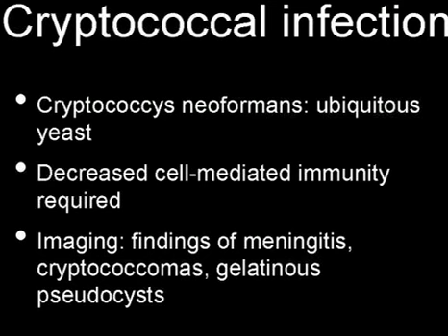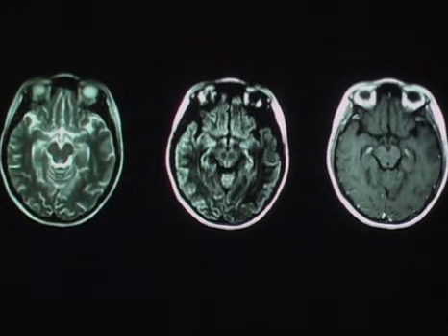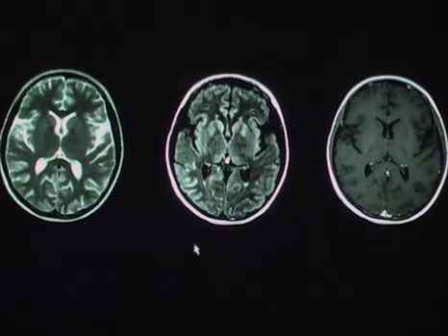So here is just an example of a cryptococcal meningitis, and again, demonstrating that our contrast-enhanced FLAIR imaging is going to be perhaps the most sensitive for this, demonstrating some abnormal signal within right-sided posterior sulci, perhaps some increase in leptomeningeal enhancement seen on the post-contrast T1-weighted imaging. Again, same patient, again demonstrating the signal abnormality seen on the FLAIR imaging, probably the most conspicuous out of the three sequences here.